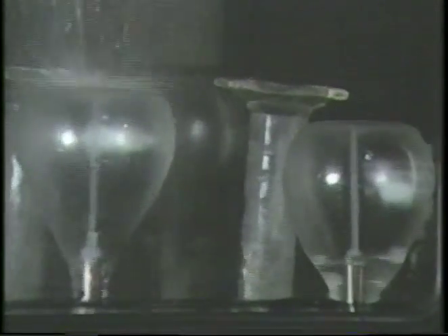The washing process is accomplished by means of a vigorously agitated detergent bath that helps in the removal of soil necessary for proper cleaning. The combination of high-velocity jet streams of water supplied by unidirectional or multidirectional spray arms develop the proper water turbulence. It should be noted that water sprayed at a high velocity does not always equate to complete coverage. Water must be allowed to cascade down the glassware. Very high-velocity water can lead to glassware breakage.